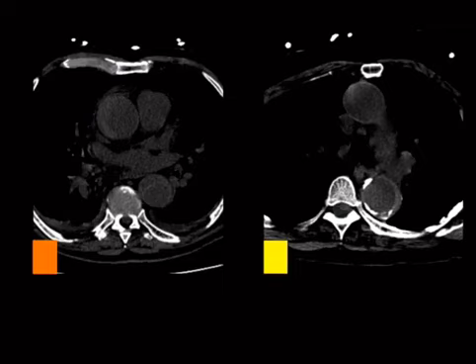So this is another this versus that, and it's to point out that just like dissection, which has a type A and a type B, you can grade intramural hematoma similarly, where you have intramural hematoma here versus intramural hematoma here. Notice that it's here too, but that doesn't matter, right? Because this is proximal to the takeoff of the left subclavian. That makes it a type A, and because we're assuming that they're not showing us that there is blood here, that this is a type B.